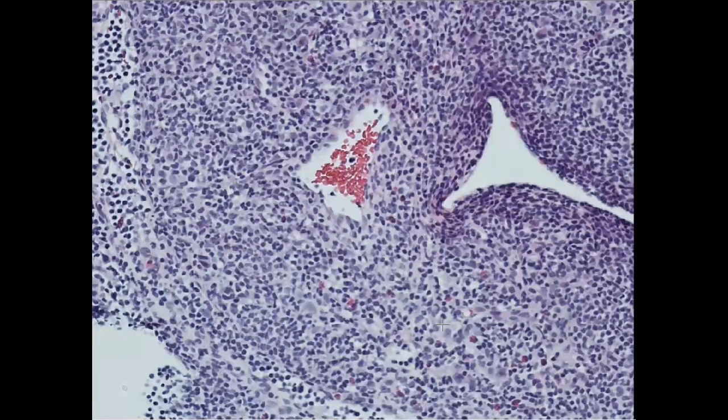From this power, the 20x, we can see some red dots here, and these are eosinophils. So when you see eosinophils in a lymph node with this number, you should suspect the presence of Hodgkin lymphoma. Can you see this one, eosinophil, another one, another? They are all scattered all through the tissue. So this is one of the signs. The background for the Hodgkin lymphoma can contain or should contain some inflammatory cells. It might be neutrophils, eosinophils, some plasma cells, and sometimes in the mixed cellularity we'll see histiocytes.